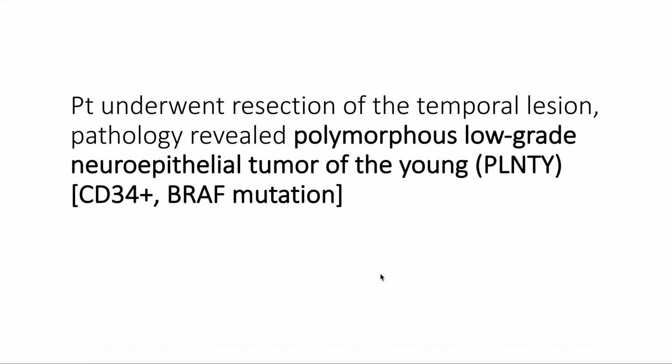This patient underwent resection of the temporal lesion. Pathology revealed polymorphous low-grade neuroepithelial tumor of the young, which is CD34 positive and exhibits BRAF mutations.